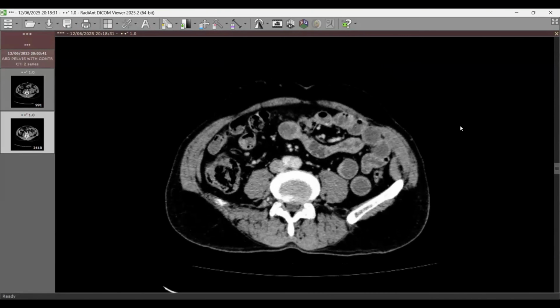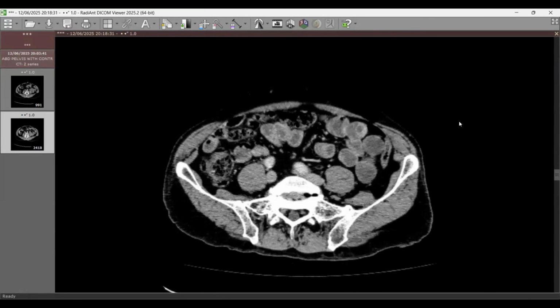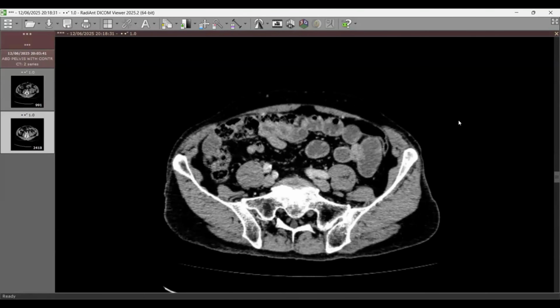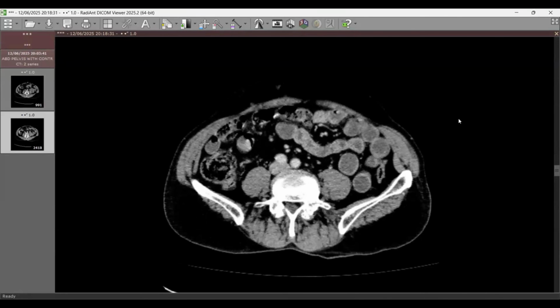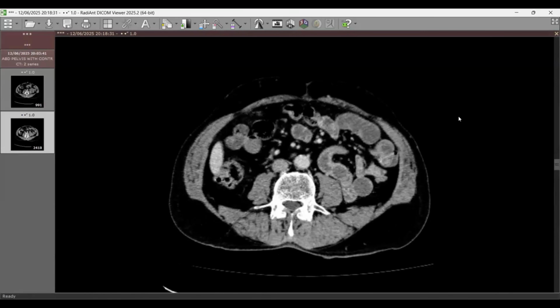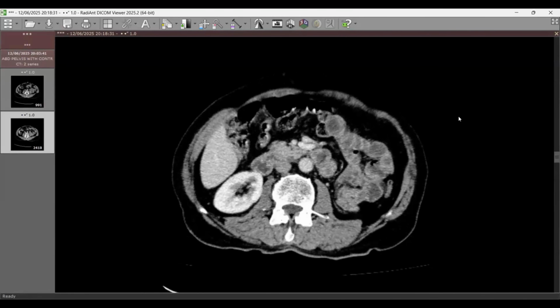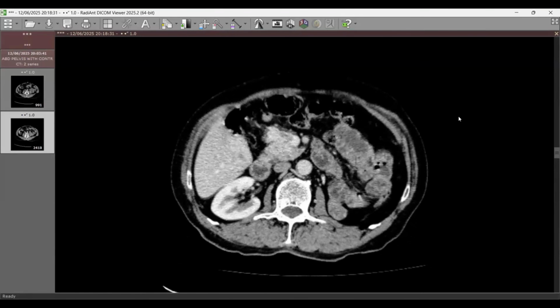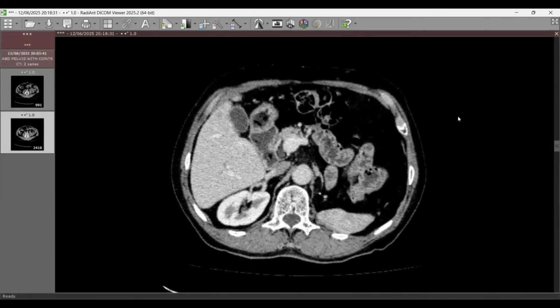I believe the lesions within the liver with peripheral, discontinuous nodular enhancement are having the same intensity as the blood pool and are in equilibrium with it. I believe that these are hemangiomas, but I'm concerned about the lesion in the periportal location. I would like to see that again. Another differential could be arterially enhancing metastatic lesions, but they should have washed out in the portovenous phase.